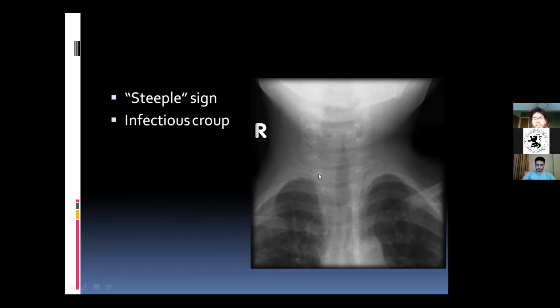epiglottitis. Okay, because epiglottitis requires another type of symptom as well, and it presents usually in older children. Okay, yeah, it is essentially laryngotracheobronchitis. Exactly. It's a barking cough. Well done. So the main thing is you have to relate this to the picture.